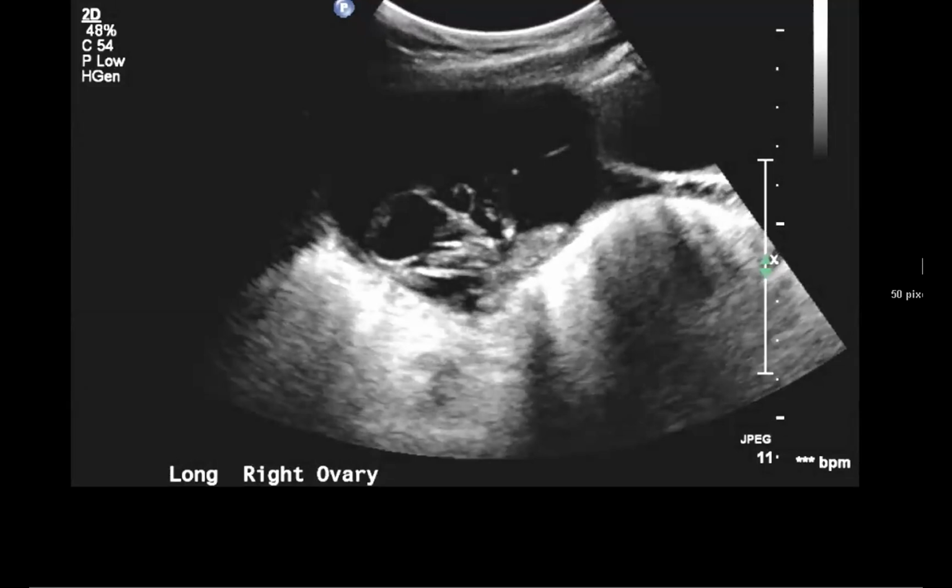Aarti, is there like a fetus in there? It was not, and also her pregnancy test was negative. And actually, interestingly, this mass was detected while she was pregnant. And then this is now her postpartum scan and the mass is still there. Gotcha.